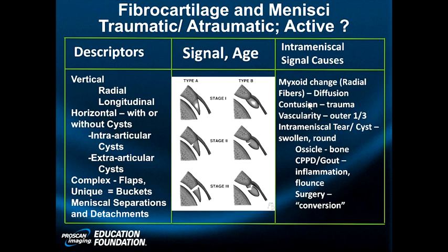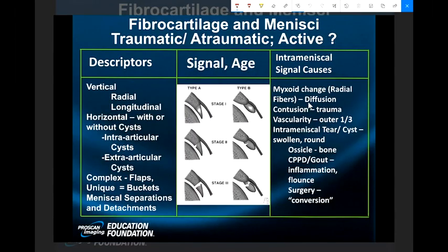And then you have conversion signal. You're all sitting there thinking, what is conversion signal? Well, here's what happens when a surgeon decides to do a meniscectomy. Let's find a clear area to draw on. This will work.